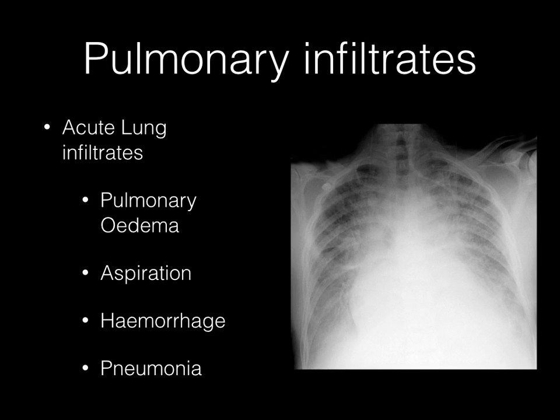And on a chest X-ray, there could be other features of pulmonary edema, such as cephalization of the pulmonary vessels, Kerley B lines, septal lines, or peribronchial cuffing, or even sometimes you can see air bronchograms within the pulmonary edema, but this indicates that there are significantly dense infiltrates within the alveoli, indicating that there's a lot of pulmonary edema in this particular patient.